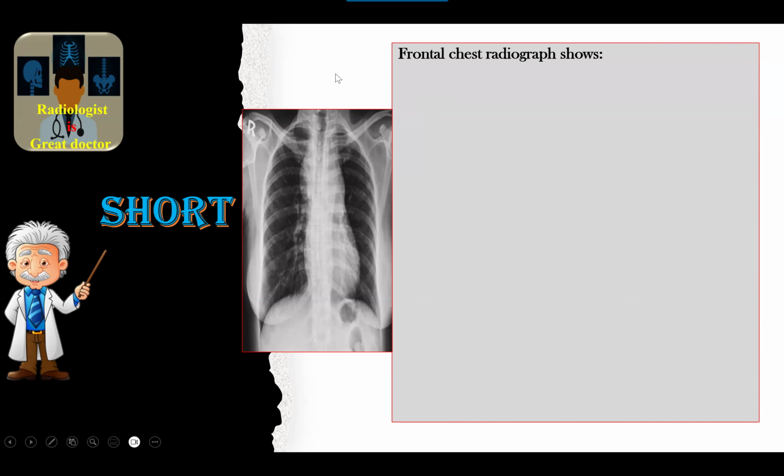So mediastinal widening, good, continuous with the right heart border, left heart border, good. And we can see the descending aorta and knuckle through it. So it is an anterior mediastinal mass. I can see hilum overlay sign and negative cervicothoracic sign. No pleural effusion.